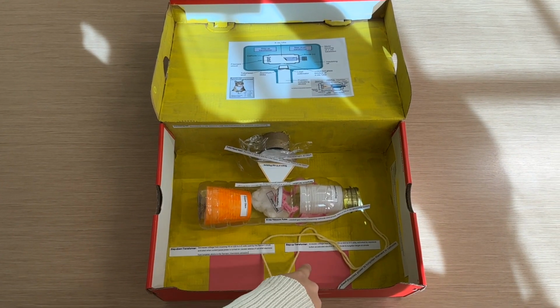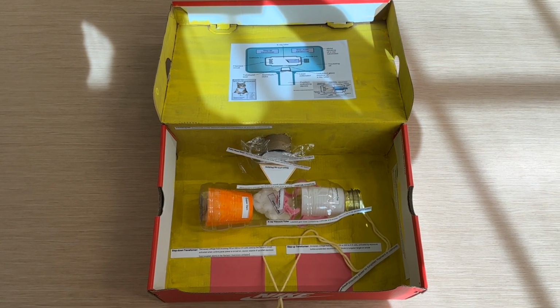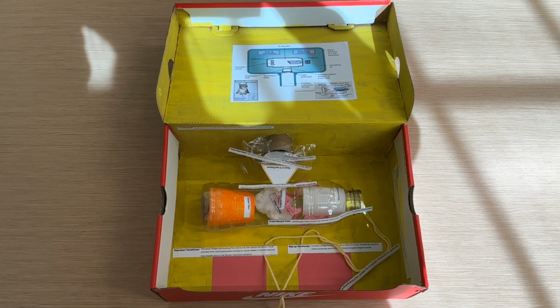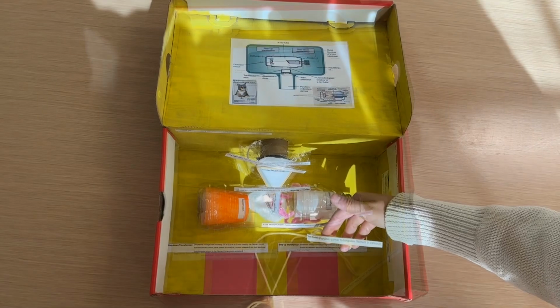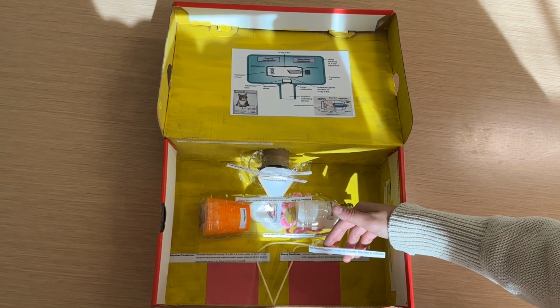This is the step-up transformer, and it increases the voltage from the wall outlet and creates enough voltage to propel the electrons toward the target. This is the filament circuit, and it uses 3 to 5 volts to heat the tungsten filament in the cathode.